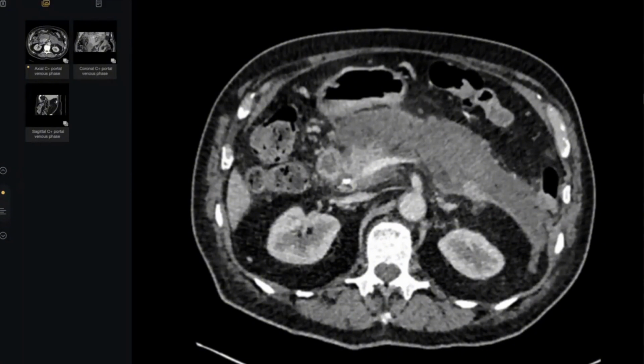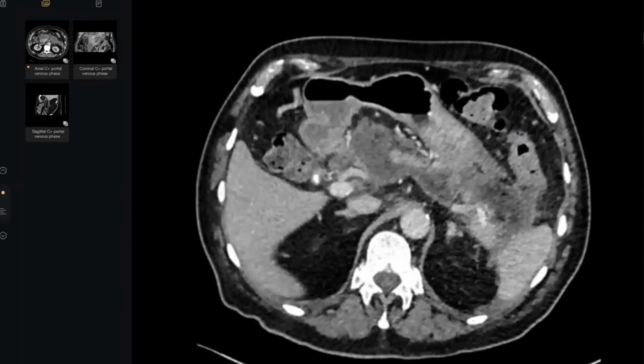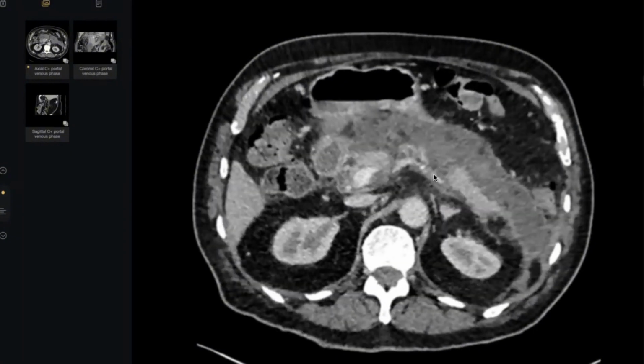Dr. Nagam, you were on the correct pathway. How can we drain all of this? And the patient is very elderly. It should be conservative right now. Actually, we don't know, because pancreatitis management depends on a specific score. I think there may be a necrotic area here. So it needs clinical evaluation, because if this is necrotic pancreatitis, the management takes another pathway completely. You picked up the stones, and it was not an easy case. This is the most important.